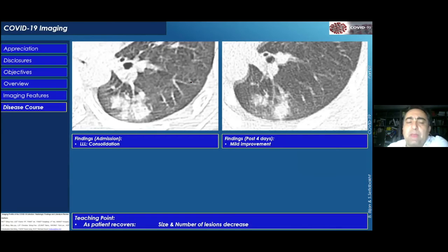Take a look at this one. So when you want to give a quantitative measurement, be very careful about this. Otherwise, you're going to get a quick phone call from a referring physician. For example, in the first case, if somebody asked me to measure it, probably I would measure it something like this. Just get the whole thing into one area. This is how I'm going to report it. But if this is a follow-up after 4 days, now on the 4 days, I'm going to basically report one lesion like this, and then the second lesion like this. And I'm going to give you these 2 dimensions.